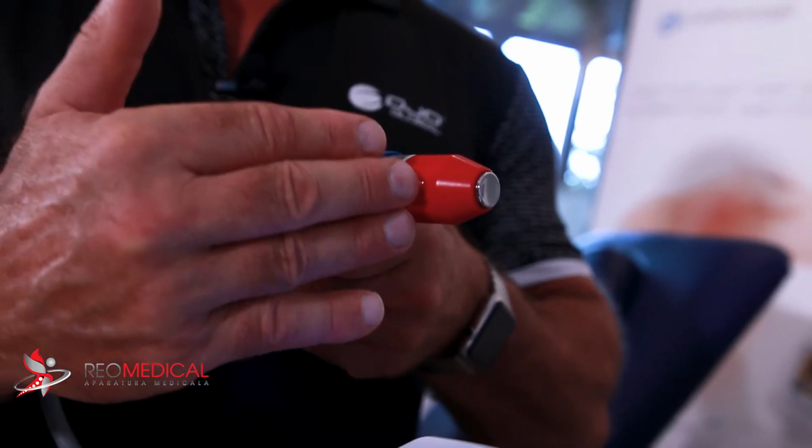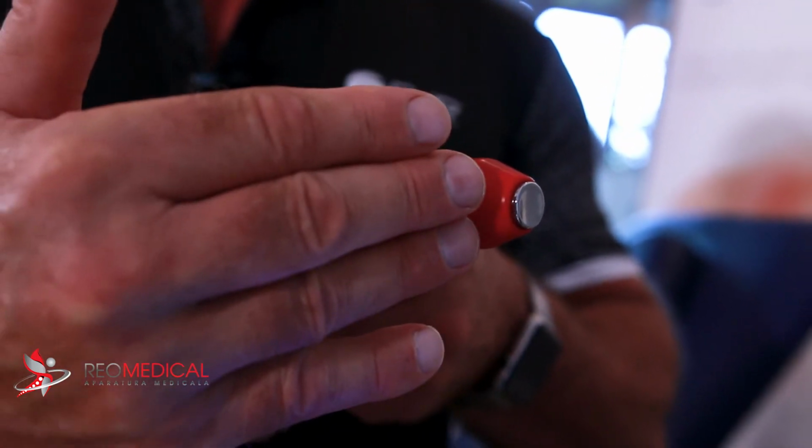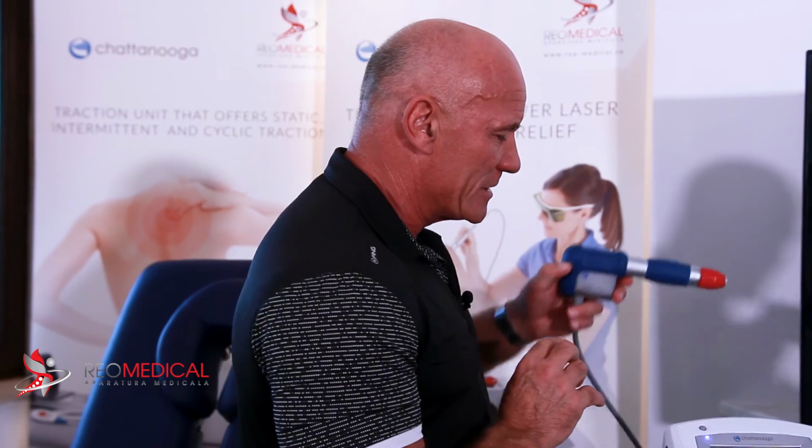And something else you need to consider, it's been shown that 50% of that energy is lost within the first centimetre of us travelling into a patient's tissue. So if we start with a very low value, very quickly we're going to get to the minimum therapeutic value. Okay? So hence why I urge you to ask what is the EFD of the transmitters, and the higher the number, I suggest the better product that you're considering to buy.